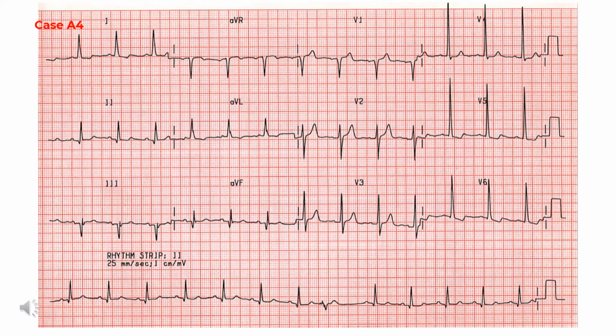The ST segments are downwards sloping or depressed in the leads that face the left ventricle, I, AVL and V4, V5 and V6. These changes fulfill the criteria for the diagnosis of left ventricular hypertrophy. There is an isolated ventricular premature beat in the rhythm strip.